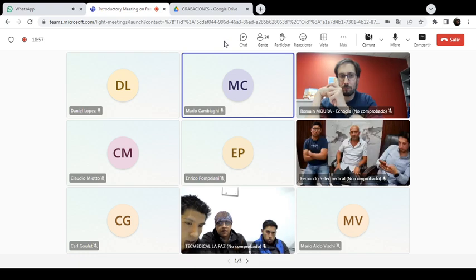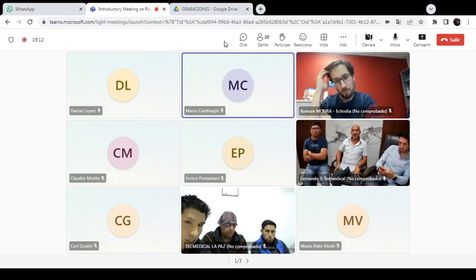It is critical, or important, to create the patient first as the first operation, because as Roman said before, based on the age of the newborn, the child or the adult, the unit will apply different parameters in order to perform the test.